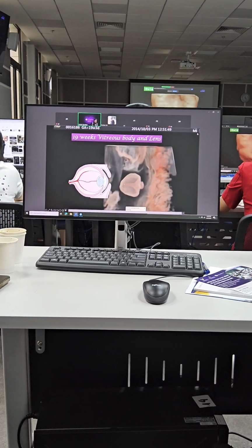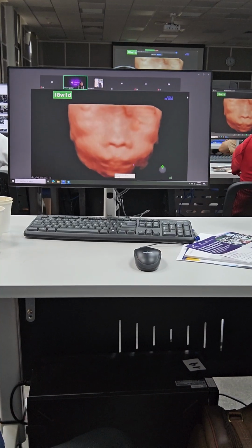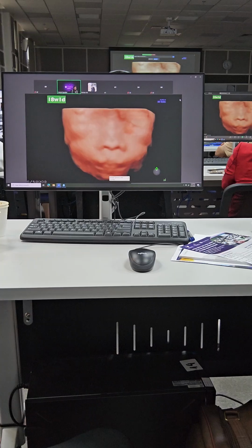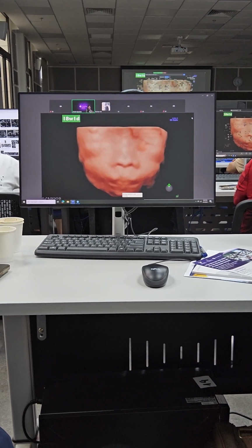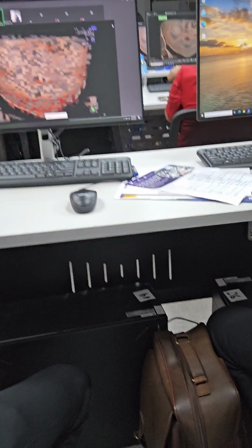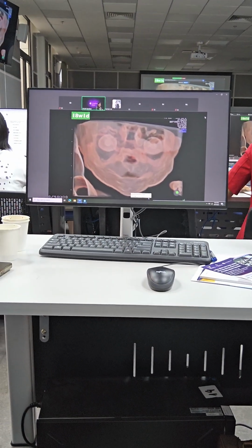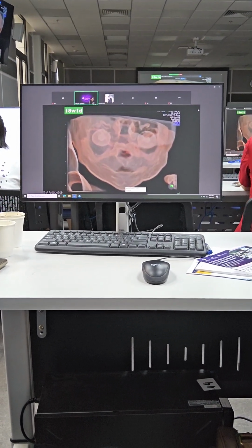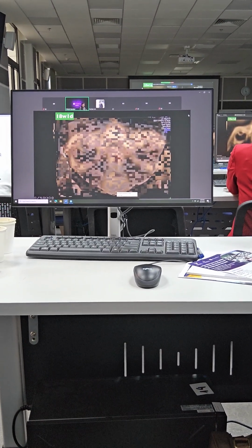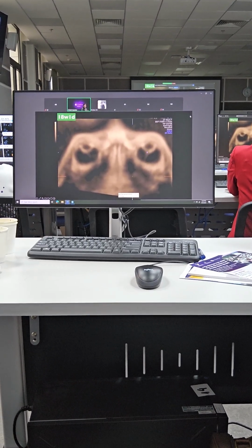Right? Now, this is the fetal face. You can see the lips and the nostril. And then, if you look at this face with silhouette ultrasound, here bilateral vitreous body with lens here. And then, if you look at the axial section of the eye, you can see the eyeballs here and the lens here and the central canal here.